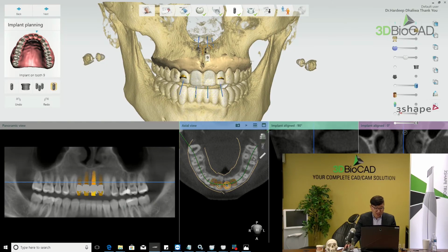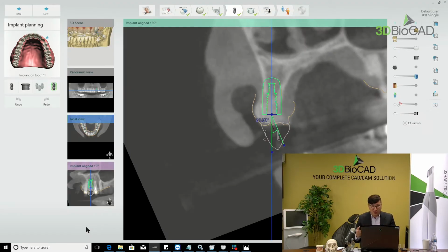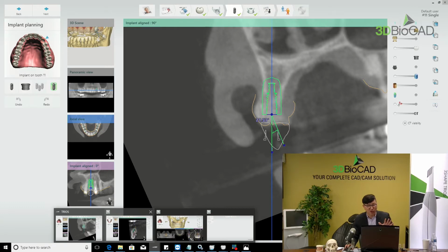And then you guys can see, I just opened multiple cases within one PC. This is the same as the dental system. You can open first, second, third, fourth, all the cases. So I just finish several cases myself and then call my doctor and do the TeamViewer to finalize my planning and the surgical guide design. Okay, so that is possible. We don't have to turn on and off, on and off.